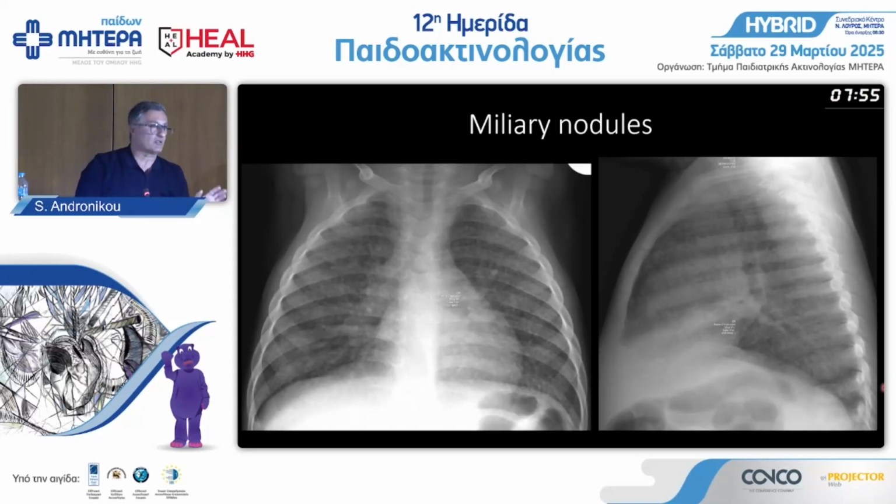If you have a patient with miliary nodules, that's another definitive sign. It's not common. It means the TB is in the bloodstream. It's just like metastases, okay? But these are metastases, tiny, small nodules, not linearities. So there are not a lot of causes that you see commonly of diffuse lung disease with interstitial pattern in children, and especially not a lot of causes of nodularity.